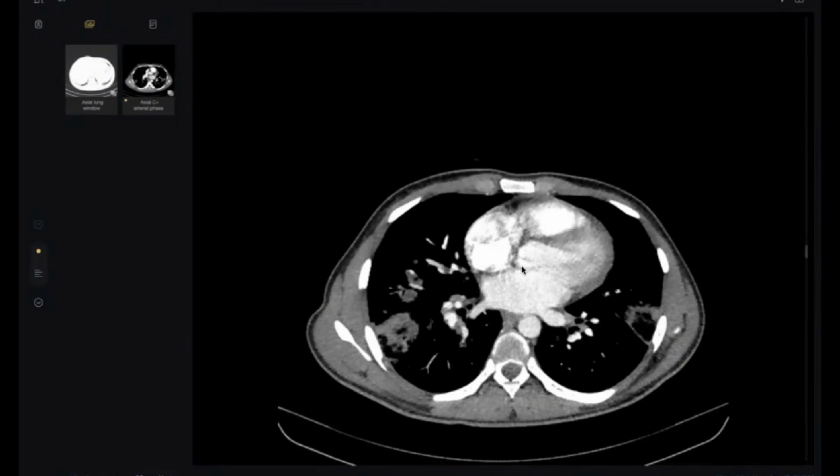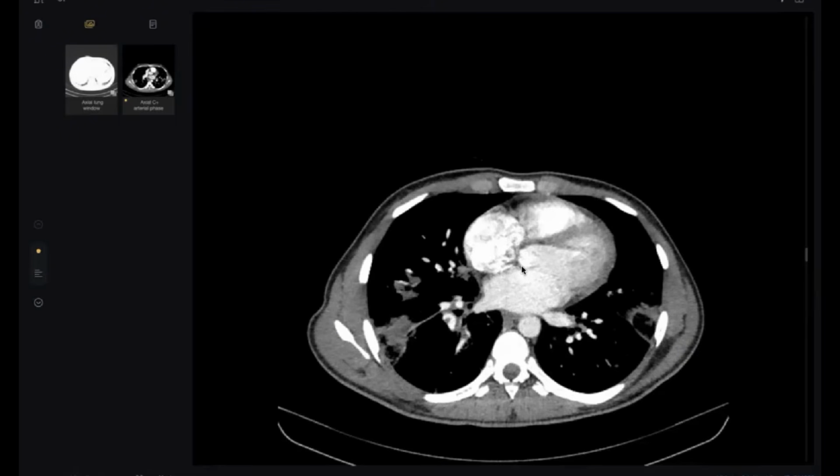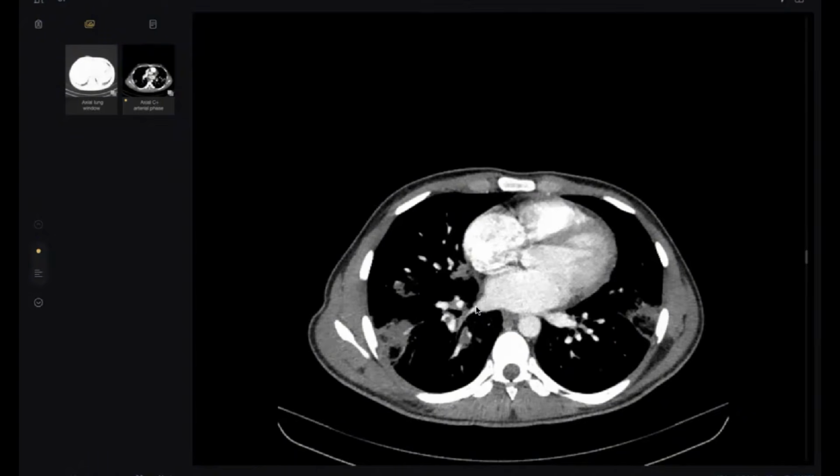Particularly for young patients, we include vasculitis, particularly granulomatosis with polyangiitis. What sign in this CT is against both of them, either cavitating metastasis or Wegener's? There are very obvious signs.